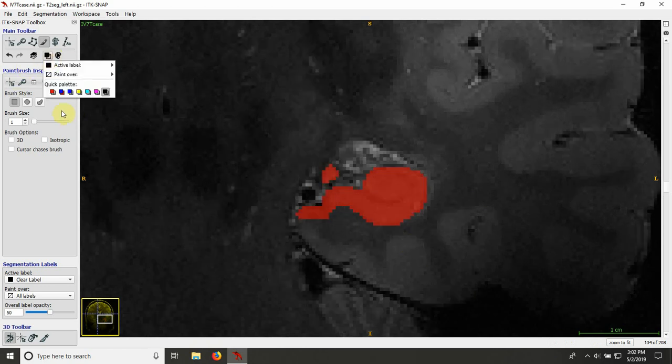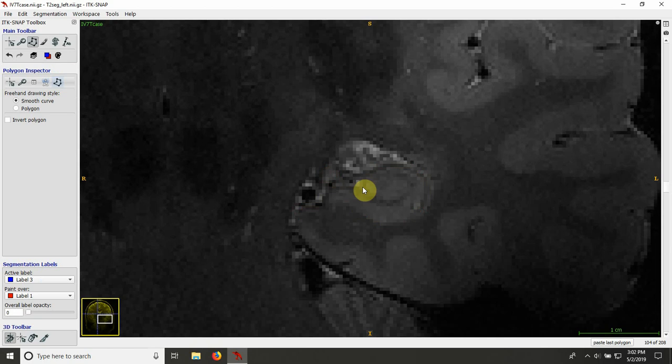So then next slice, again, I would go through the midpoint. And I think actually the SRLM stops here. So for the rest, I would just go like this for now and accept it. But then this portion of the border of dentate gyrus and adjacent regions needs to be adjusted, and that can be adjusted based on the segmentation protocol that you're using.